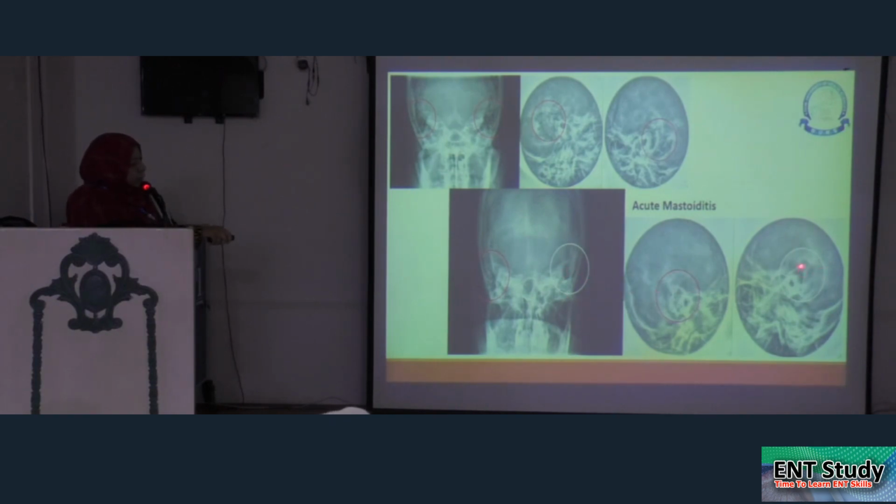bony defect which is air-filled, behind and superior to the external auditory meatus. There is no surrounding sclerosis. This is most likely due to the defect of a mastoidectomy on the left side.